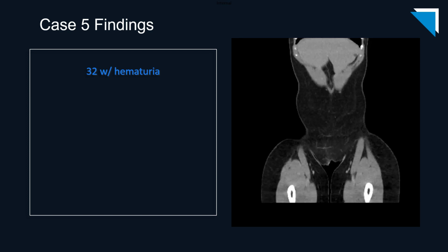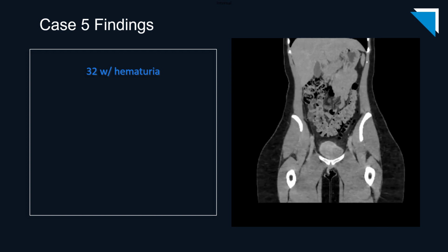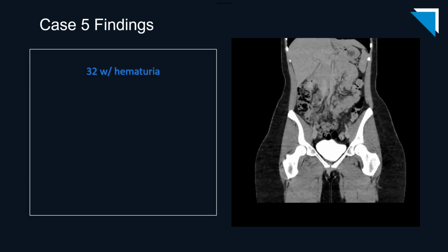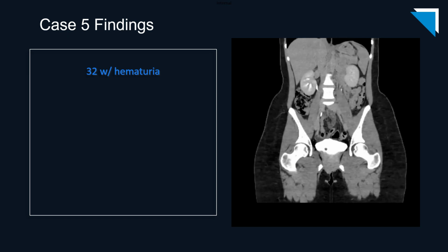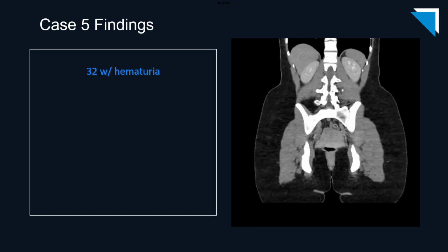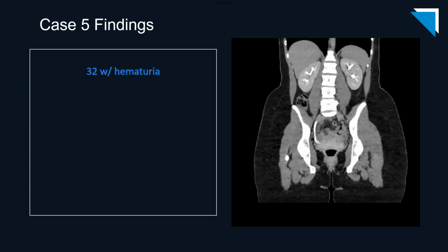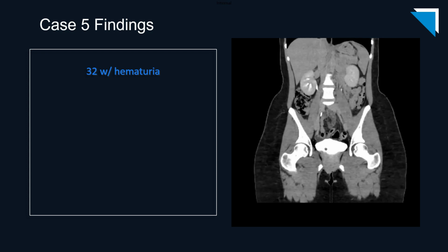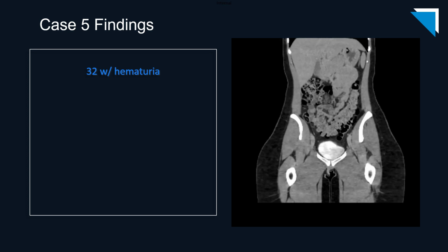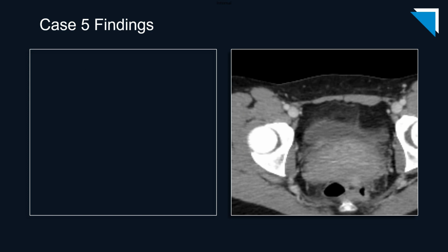And finally, the coronal reformats from that same delayed series. Let's begin our review with this single slice at the level of the lower pelvis.